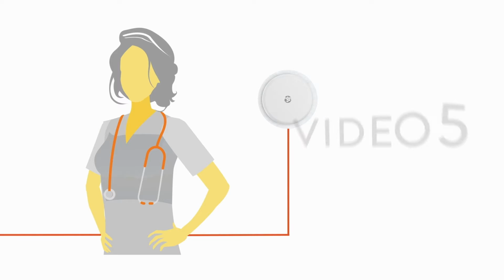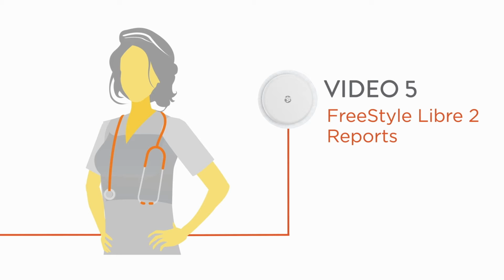In this video, we're going to talk about FreeStyle Libre 2 system reports and how they can help you with your diabetes management.